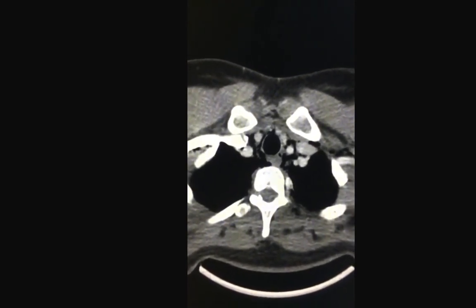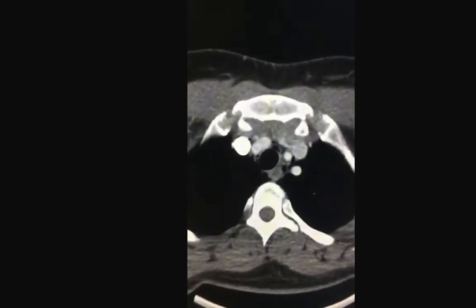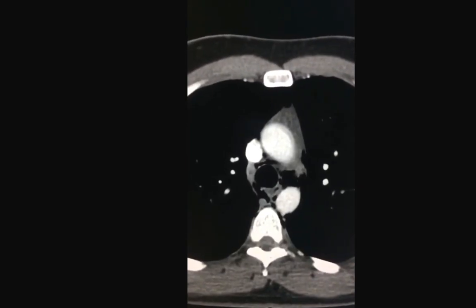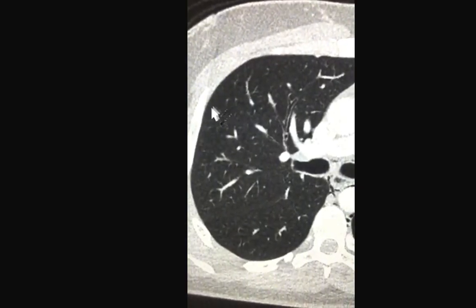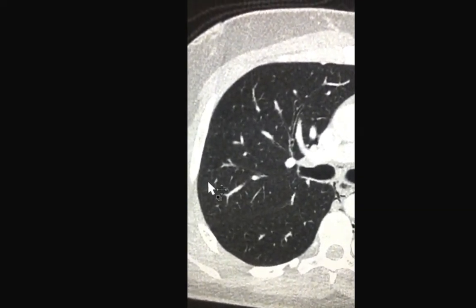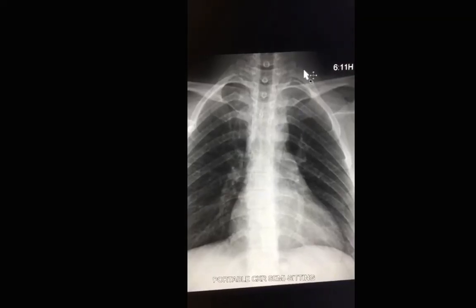It's very important to make sure that the esophagus and tracheobronchial tree appear normal on the CT. Also make sure that there is no associated pneumothorax because a small pneumothorax may convert into a tension pneumothorax, which is dangerous. To summarize, always look at the edge of the film.